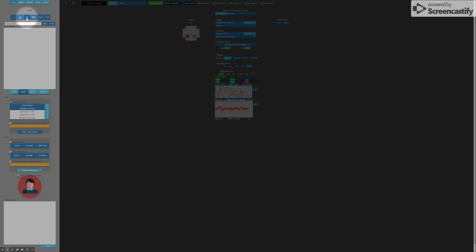So I'm going to say, as trainer, hi to client 4. And client 4 is going to respond on this other computer. I call it up, and he responds with, "How can I help?" Okay, that's chatting. But you can also send notifications if the client or the trainer is offline. The trainer can make notes. And the client can also post their image here.